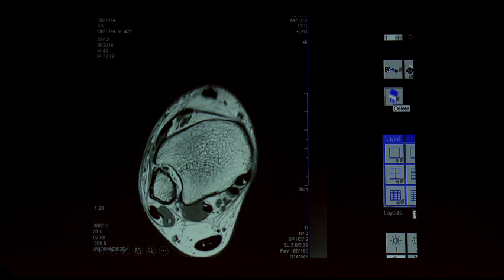This is tibialis posterior, TP, FDL, FHL. This FDL and FHL are surrounded by, you can see, a classical flexor retinaculum. So between these two important structures, this is FDL, this is FHL, there is a flexor retinaculum, and what we are seeing is the tarsal tunnel.